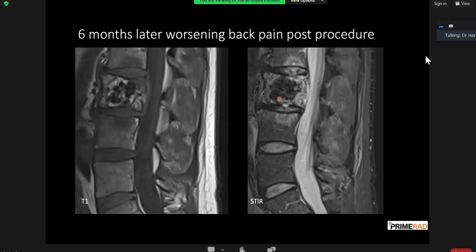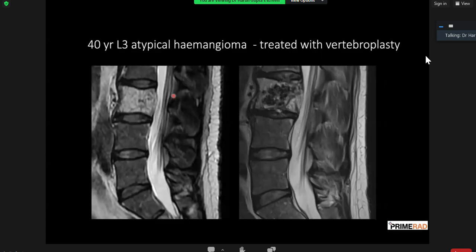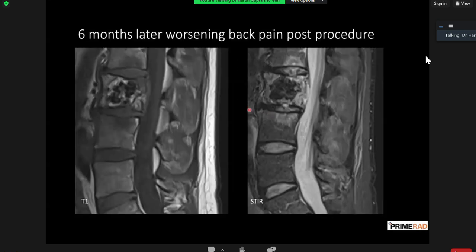The surgeon does an MRI, and this is the new finding. If you look at the previous one, the end plates were fine. There was nothing here. Whereas in this one now, there is end plate signal change, edema, disc edema, and some new signal changes and new bone formation anteriorly. So we're worried whether this could be infection, but equally, can this be an aseptic spondylodiscitis? We don't know. Luckily, this patient also had a CT scan for evaluation of the cement, because the surgeon wanted to see if the cement had gone out.